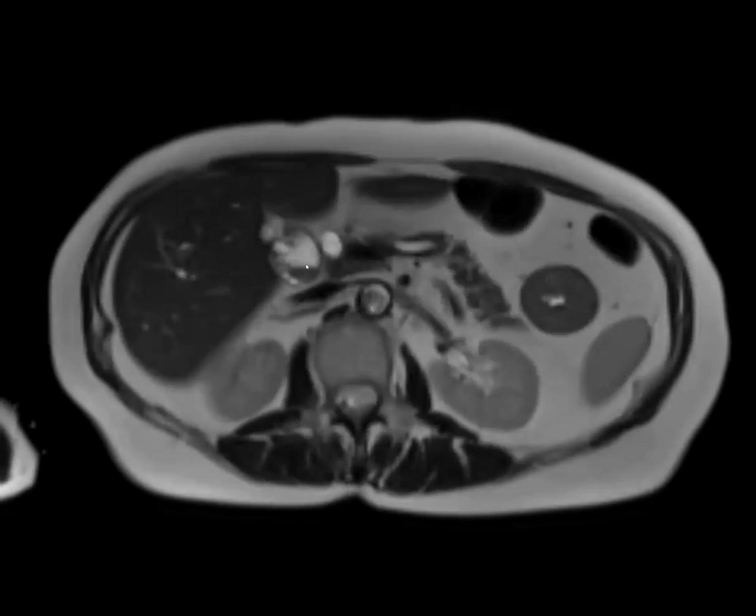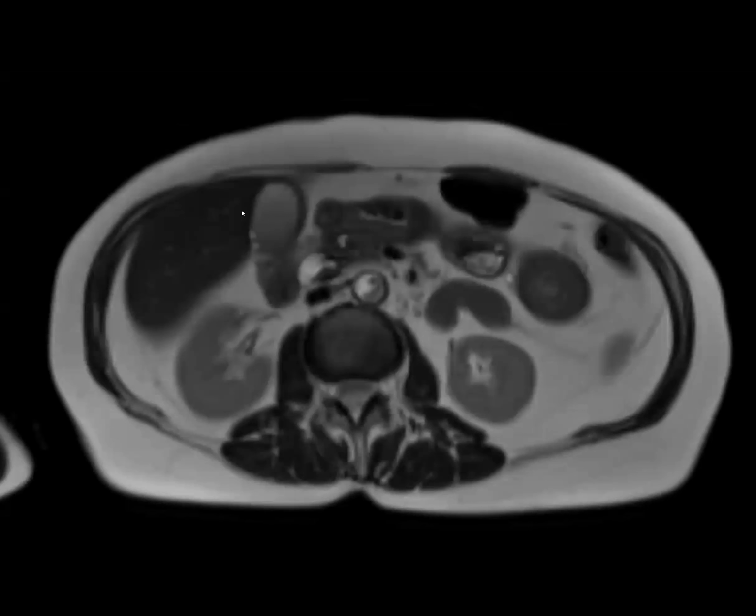And actually, these two chambers, sometimes people bring up duplicated gallbladder, but it's much more commonly just an hourglass gallbladder with a ring of adenomyomatosis in the middle that's kind of constricting it.